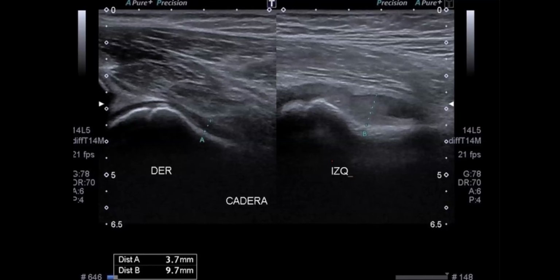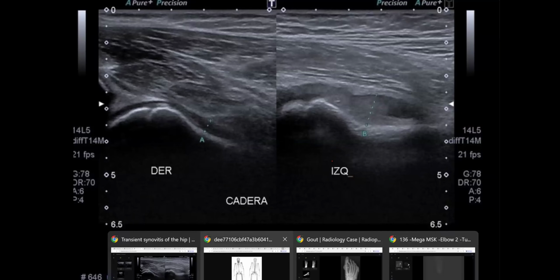Okay, let's go to this case, hopefully easy. This is one of the images of the bone scan, and I can see almost bilateral and symmetrical uptake in the femur and tibia bilaterally. Sir, I cannot appreciate the kidneys in this image.